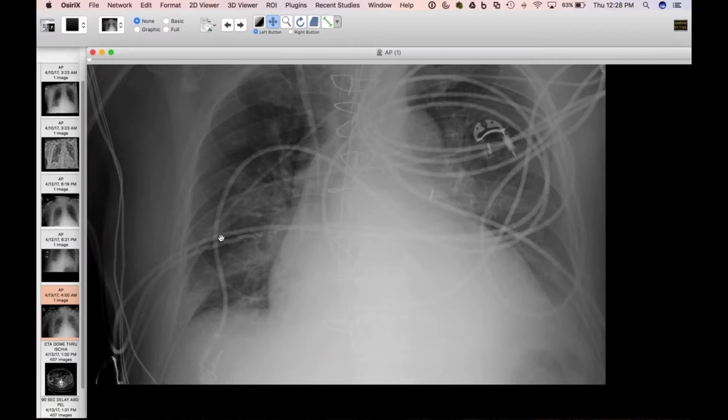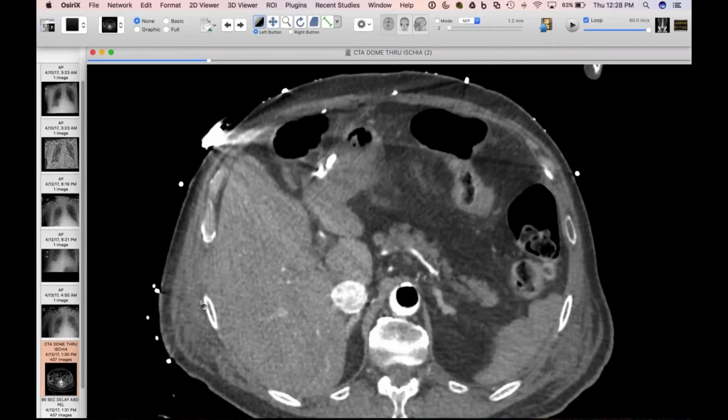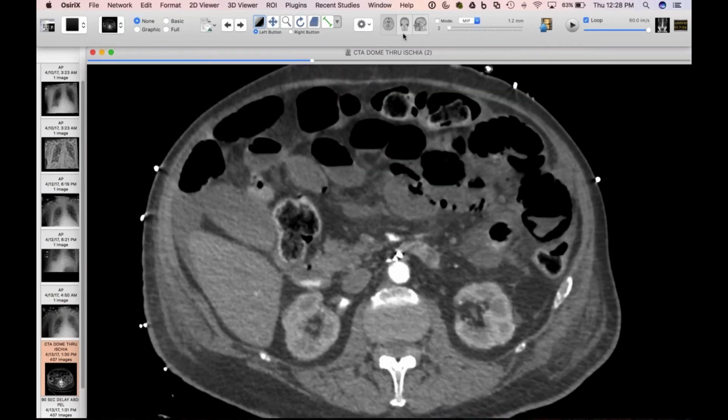So I think, Travis, you could figure out how high it went by the length. The balloon is 25 centimeters usually in these things. So you can extrapolate from the abdominal position and figure out where it would have been. Yeah, I wish we had a CT. Let's see.